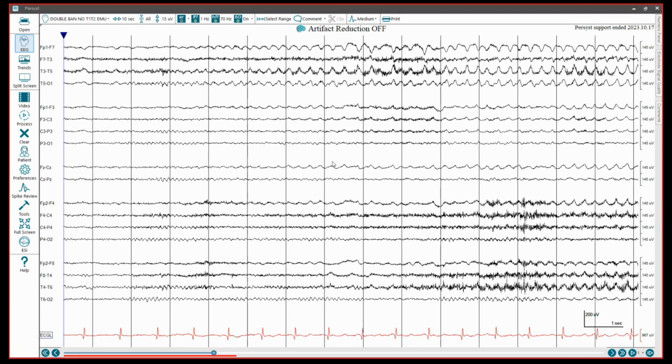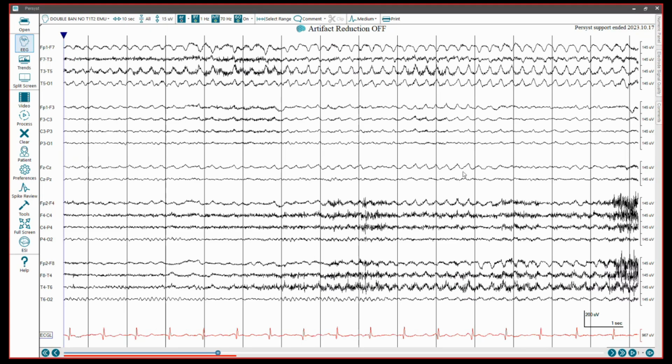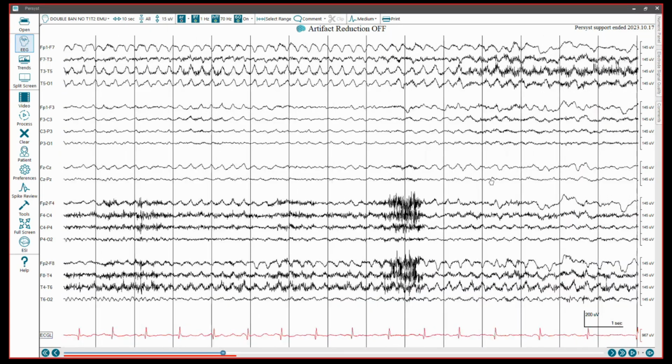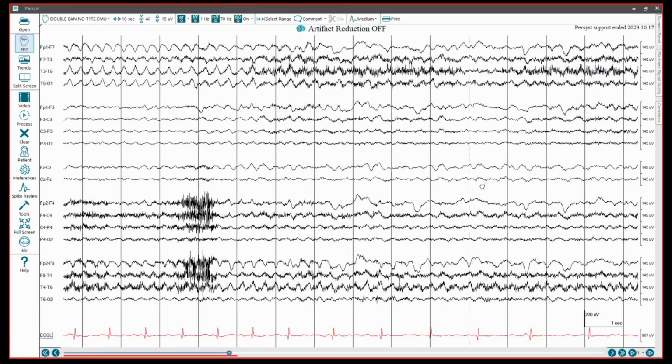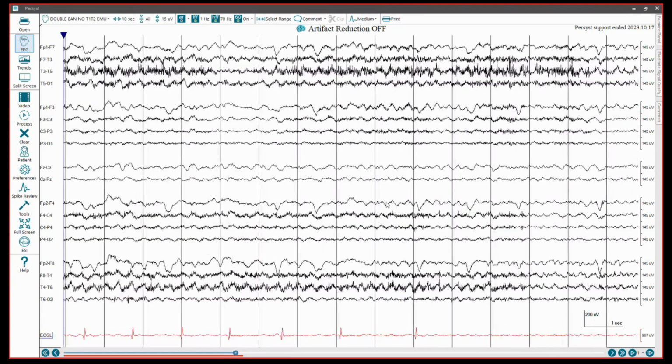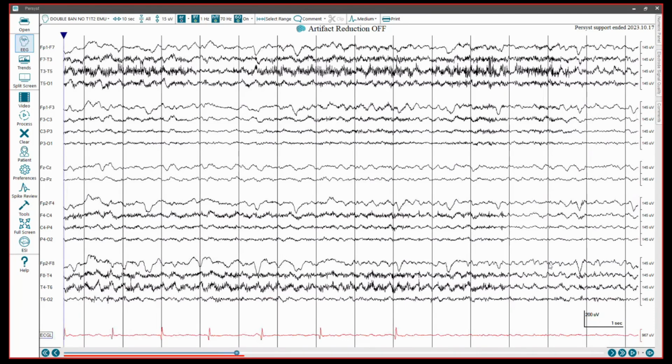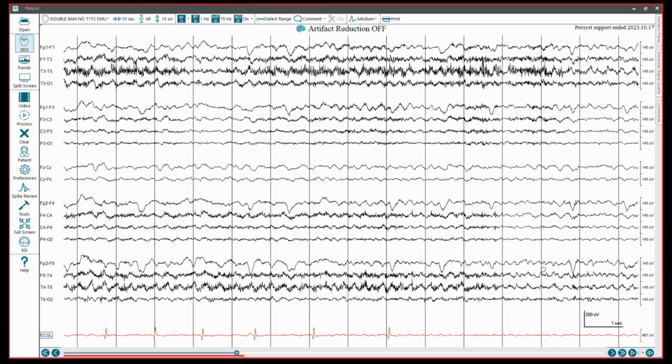We're moving along. Now notice what happens in the single lead EKG. Look what happens in the ECG channel. We actually see asystole. We see the heart rate stop. So from this point, this is the last beat that we'll see for a while. There is no heartbeat.